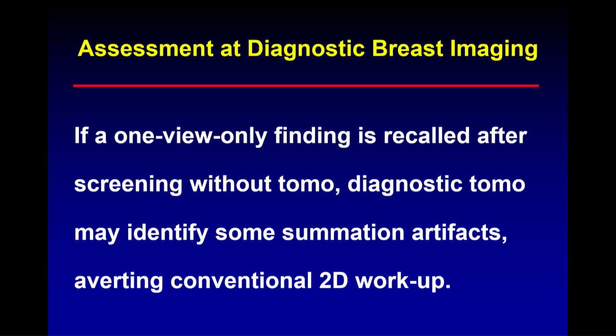Now, we still do 2D in addition to the DBT acquisition on all our screens, because we do not believe, and we know we're right, that the 2D mammo is a better mammo than a synthetic mammo. I mean, how many of you, given a choice, would read a synthetic or a 2D mammo? You'd read the 2D mammo, it's just a better picture. The 2D is good, and it shows almost everything, but it doesn't show everything. And where it lacks especially is in focal asymmetries. And those are the earliest cancers.